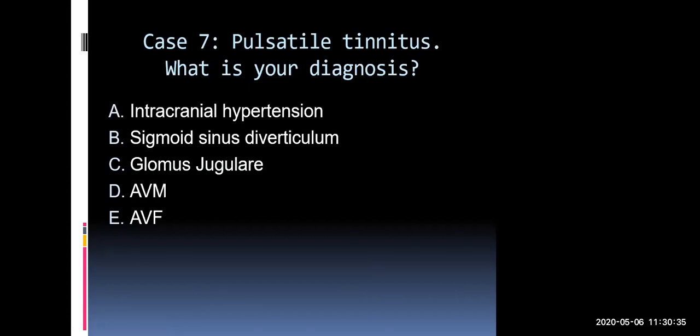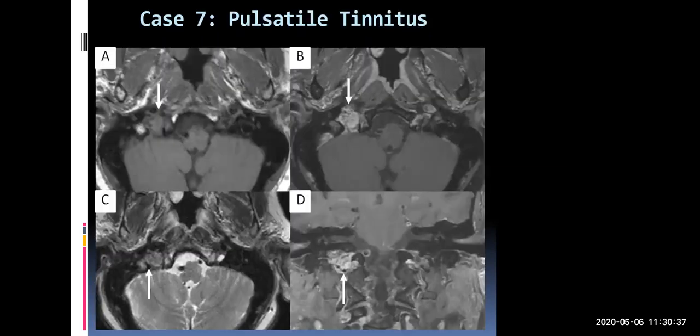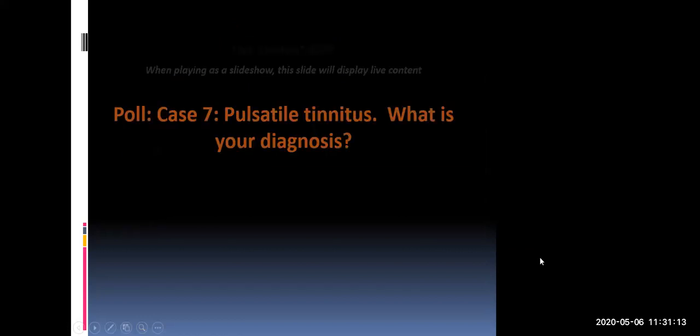So this patient clearly has a glomus jugulare tumor, which is really centered around the jugular bulb. You can see these flow voids, these dark spots on post-contrast T1, are giant vessels, and the speed of blood is so high within them that you don't capture the same protons, or the contrast material, as it is going through between the excitation and the recording phase, or relaxation phase, of the MRI. So this speckled pattern that you see, these are all giant blood vessels, as is characteristic of glomus tumors.